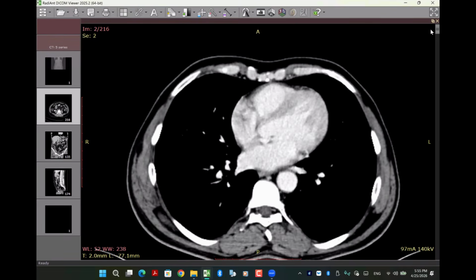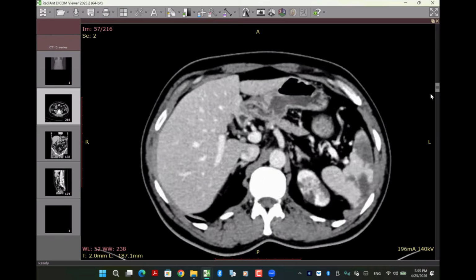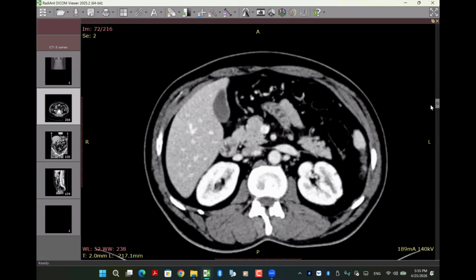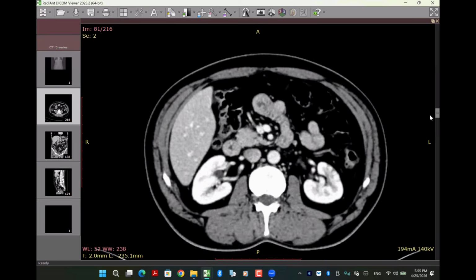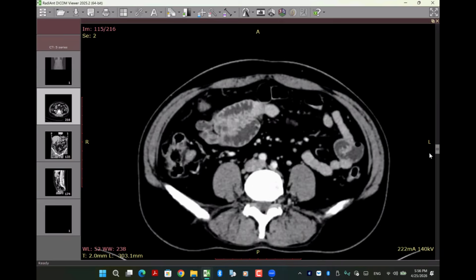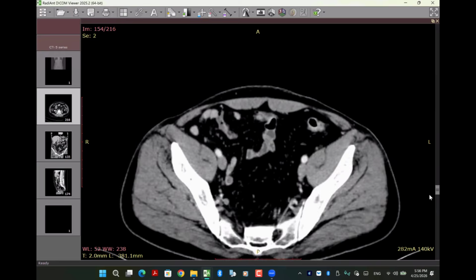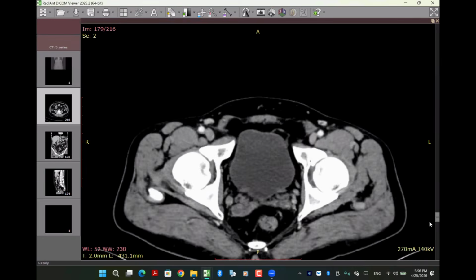Okay, so I've been presented with the axial contrast enhanced CT lower chest and abdominal images of a patient, in which I would like to take a moment to scroll the imaging stack. So I would just like to go till the last cut, simultaneously noting any significant abnormality.